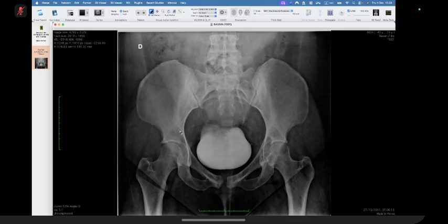I'll immediately inform the findings to the referring physician, and the patient needs to have a screening for multiple myeloma. Can I stop you? Sure. Number one, can you point out where you see the lytic lesions in the pubic bones? Are you able to see my arrow? Yeah. These are just projectional. All of these? Yep. And what about any other areas? Yep, just projectional, all of these are just technical.